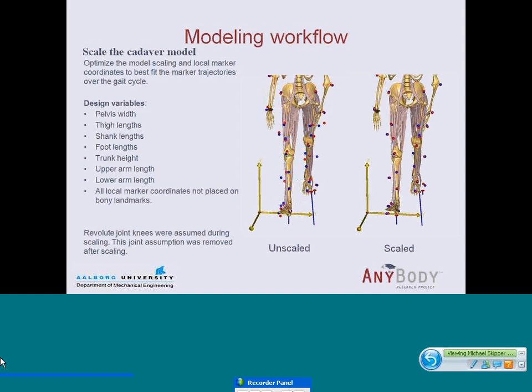during gait. And then the markers that were placed on the middle of the segment, so for instance the one up here on the thighs and so on, which were actually very undefinable in terms of where they actually went on the model geometry, I optimized those using an optimization-based method with the objective of minimizing the residual between the markers on the model and the measured markers over the entire cycle.